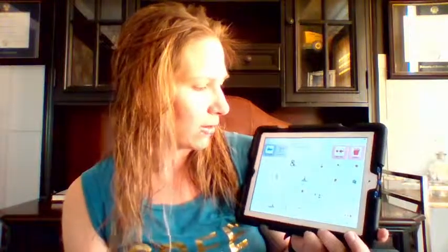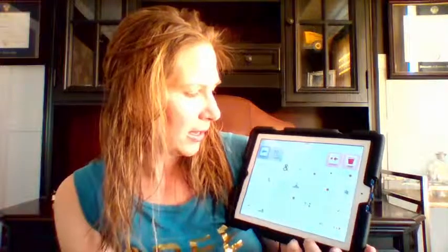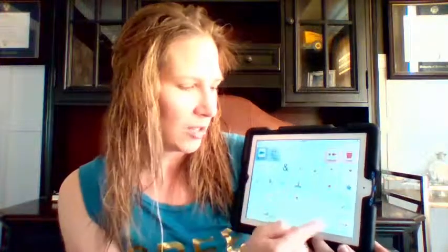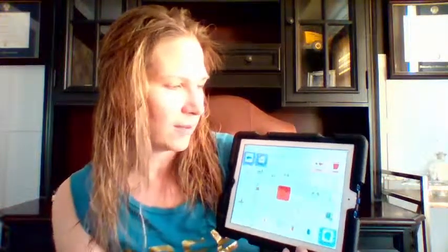And there are pictures to support the words. If I'm looking for a word, let's see here. If I'm looking for the word done, okay, so I want to say done, I can go into ABC words, and it's organized alphabetically, so ABC, and then it goes to F. So it wasn't on this first page. There's actually another page with more words where I can look for D again, and there's done.